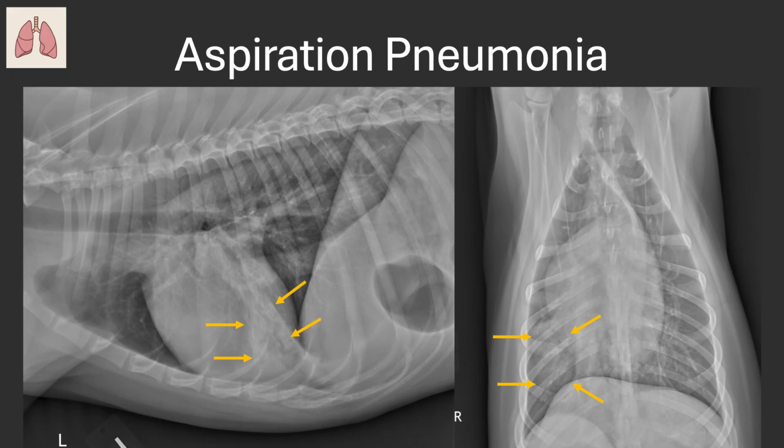Another circumstance where the bronchi are more easily visualized include when they are surrounded by fluid or cells, such as with the previous case of aspiration pneumonia, where there were well-defined air bronchograms. In this prior case, the walls of the bronchi are still normal, and the gas-filled bronchial lumen is defined because they contrast with the surrounding soft tissue opaque lung.